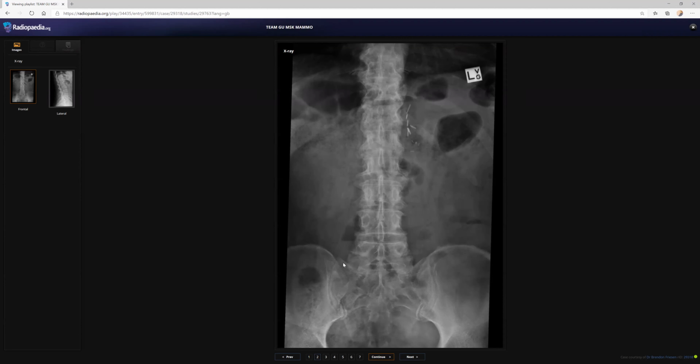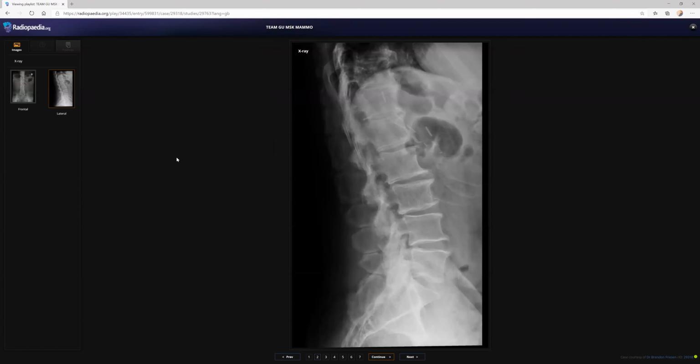So what will you do when you are stuck? I would go for further imaging like CT. Before going to CT? I can do a bone scan, but usually renal cell carcinomas are osteolytic, so most likely the bone scan would not show them completely. Before going to the bone scan? I would look at another view of the X-ray to see the pedicle. Definitely.